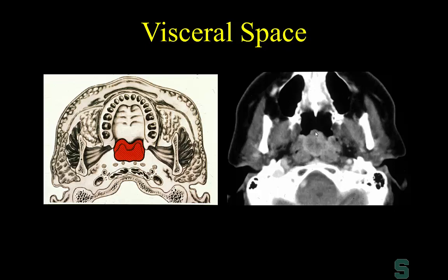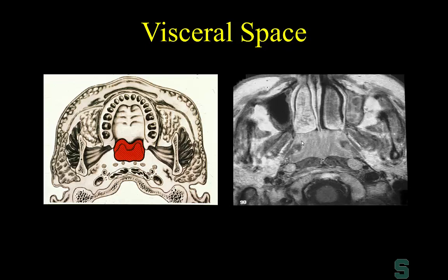So to reiterate this point, yes, this could be squamous cell carcinoma, but this was actually metastatic adenocarcinoma. Now, there's no way we can make that diagnosis. But what we need to be able to say is that the mass is in the visceral space, comment on potential spread patterns, look for deep extension. That really is the job of the head and neck radiologist.